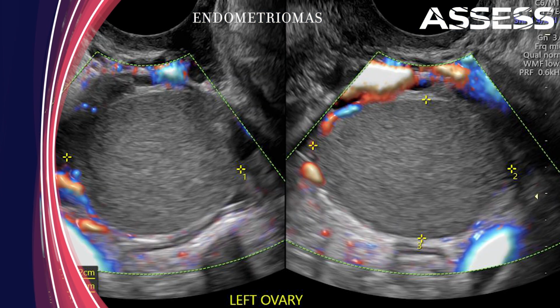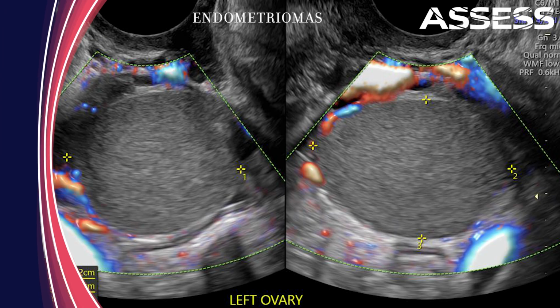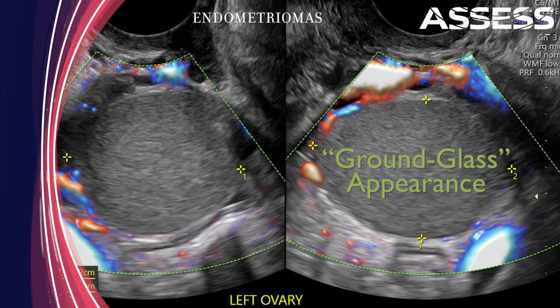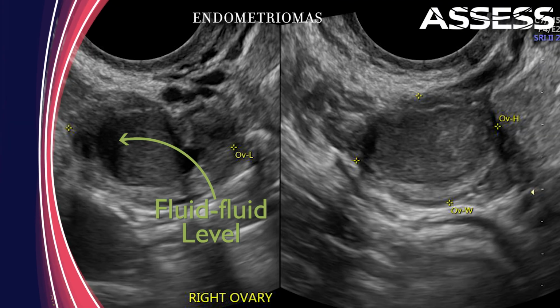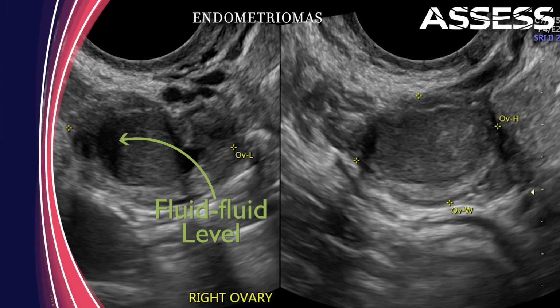The classic appearance of an endometrioma is a well-defined, smooth-contoured, unilocular cystic lesion containing diffuse, homogeneous, low-level internal echoes, often referred to as a ground glass appearance. Occasionally, a fluid level can be seen. The location, number, size, and appearance of any endometriomas should be documented.